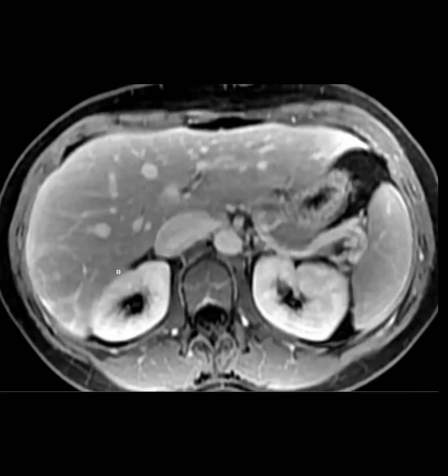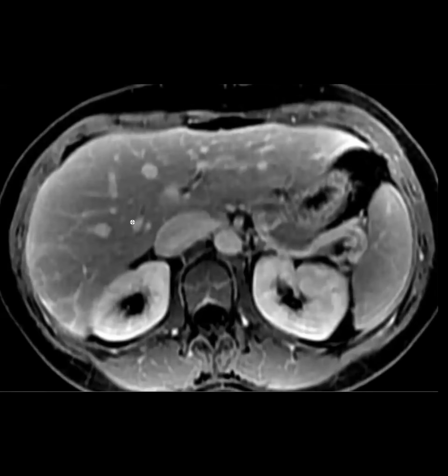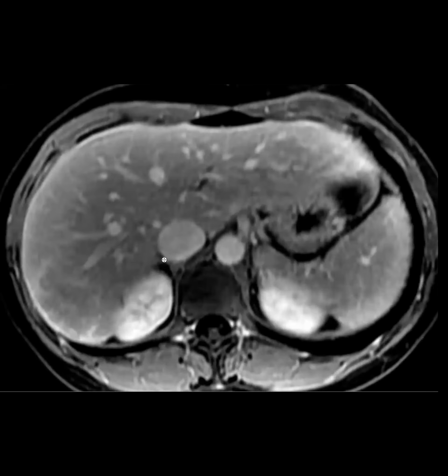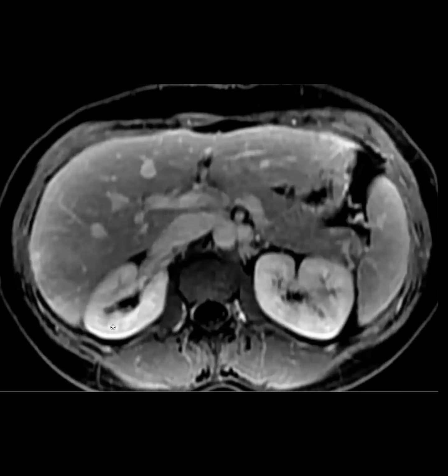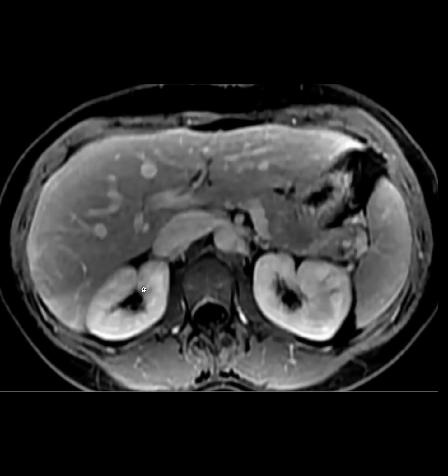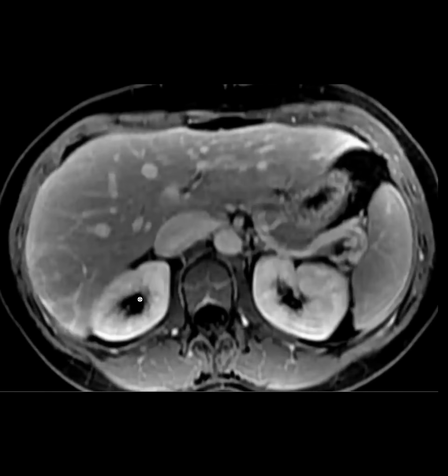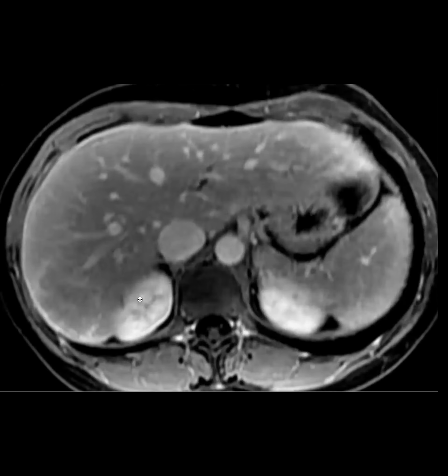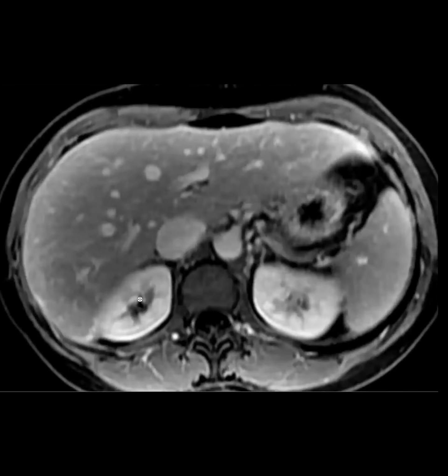It certainly needs a workup. And with this appearance, I still would think more of adenomas. Christine, go down to that lesion you just showed with the slight washout. I've seen that a lot. And one thing I think is that because it's displacing vessels, it gives more of that appearance.